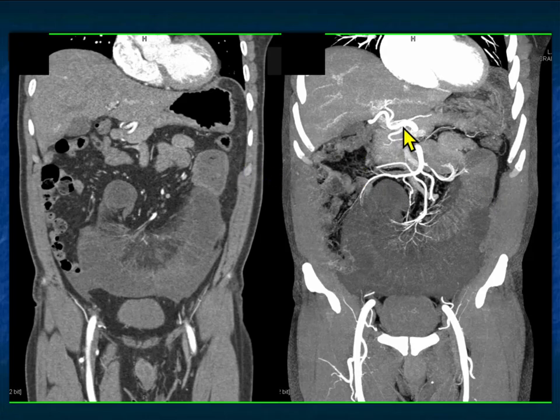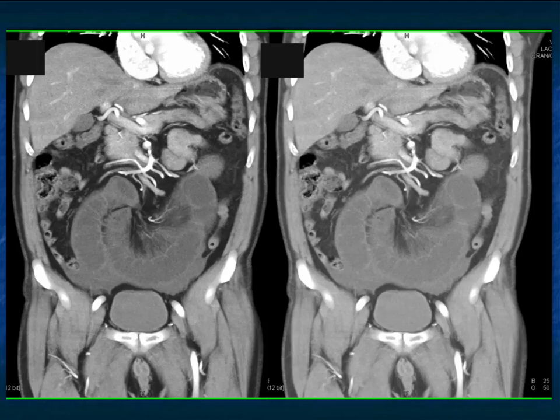Now you see, here's the mesenteric vessels. SMA, the vessels look twisted and small. You see the haziness in the mesentery. You see the haziness around the vessels, and the vessels are all really tiny. That's because there's a twist. There's a volvulus present. This loop is not enhancing. Even when you put it on the MIP imaging, you see minimal enhancement.